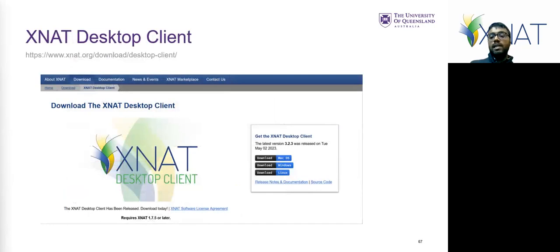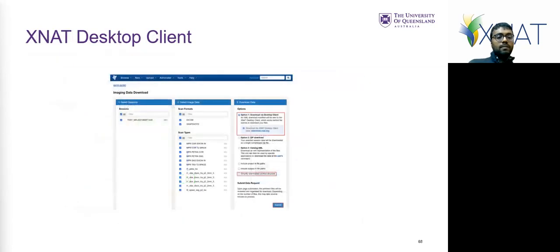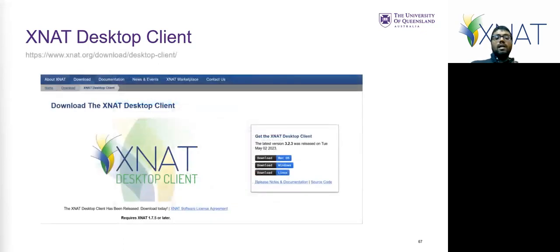XNAT desktop client. This is a client that's maintained by the XNAT development team. So we're just showing how it works. Basically, go to the site and download the correct client for your operating system and install it. It's just a typical installer.